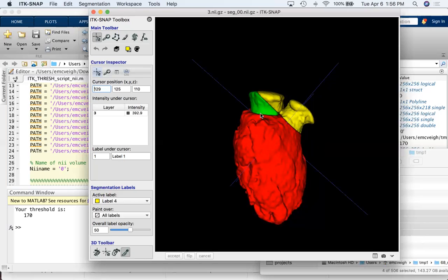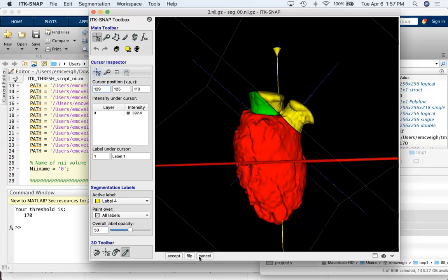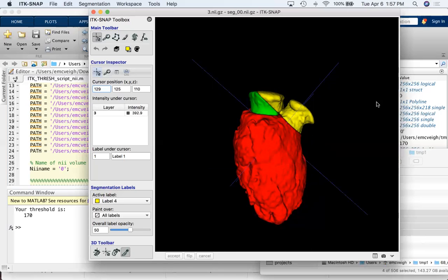So if you were to trim them all such that there was a constant distance here, then that would get rid of that effect. But I think it's fine. Probably just leave it like this. And if we need to cut the leads artifacts, that's a whole other story. Let's stop the recording.